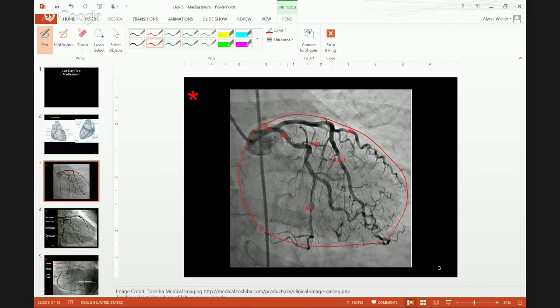One of the first things I try to look for when looking at angiograms of the heart and coronary arteries is the LAD, okay, because to me that's one of the most obvious landmarks. So the LAD should be going to the apex of the heart, which is right around here, okay? Some people were saying in lab that it looks like multiple vessels are going here, but the LAD goes more or less straight to the apex. It's kind of given away here because it's labeled, but the LAD is going straight to the apex over here, okay? These other guys are meandering around. They are not going to the apex.